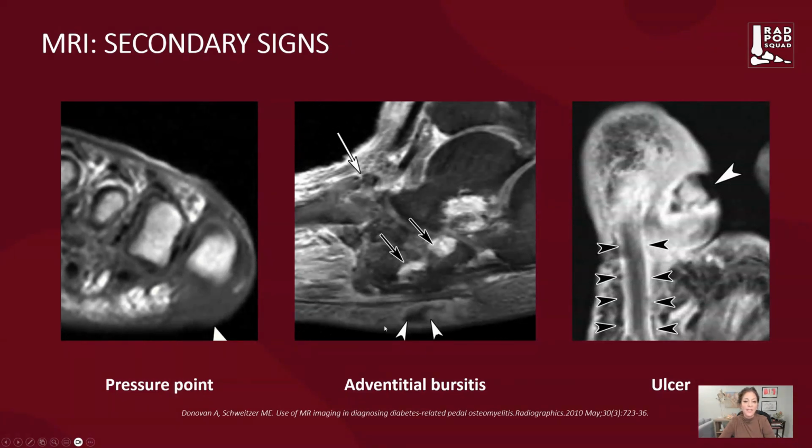And what first can be shown is that there's a blister occurring at the soft tissues in the area where there's increased pressure secondary to hindfoot supination. And when the blister opens, of course, that will be a source of ingress of infection and can cause cuboid osteomyelitis, very common. This is a nice example along the plantar aspect of the great toe, showing the flexor tendon and enhancement along that flexor tendon, denoting septic tenosynovitis. Notice the large ulcer that's penetrating along the lateral border of the great toe pulp.